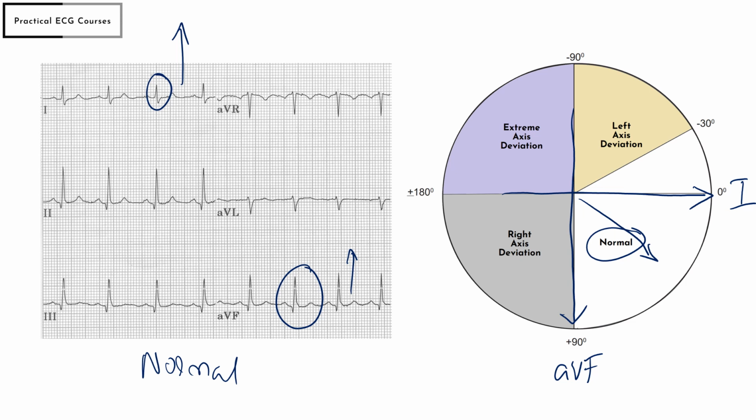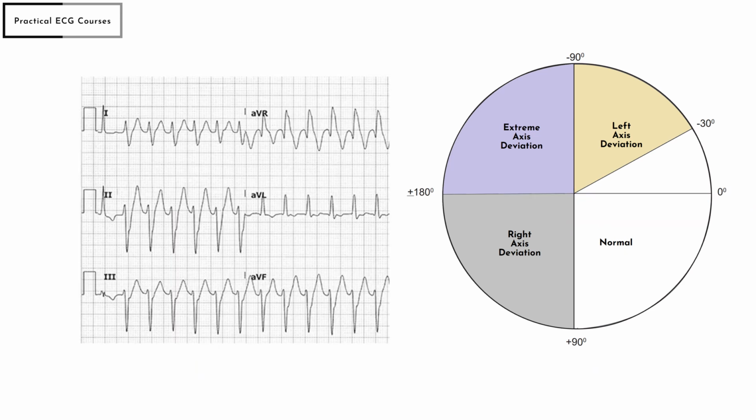If you understand this concept, then let's move on to the next one. If not, please listen to this once again because we are going to be applying the same principles for all the ECGs that are going to follow. Now let's have a quick look at this ECG.